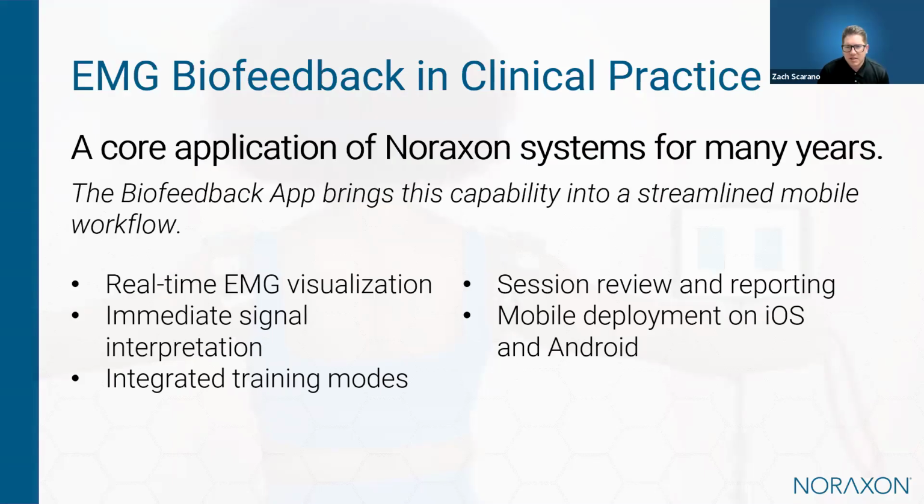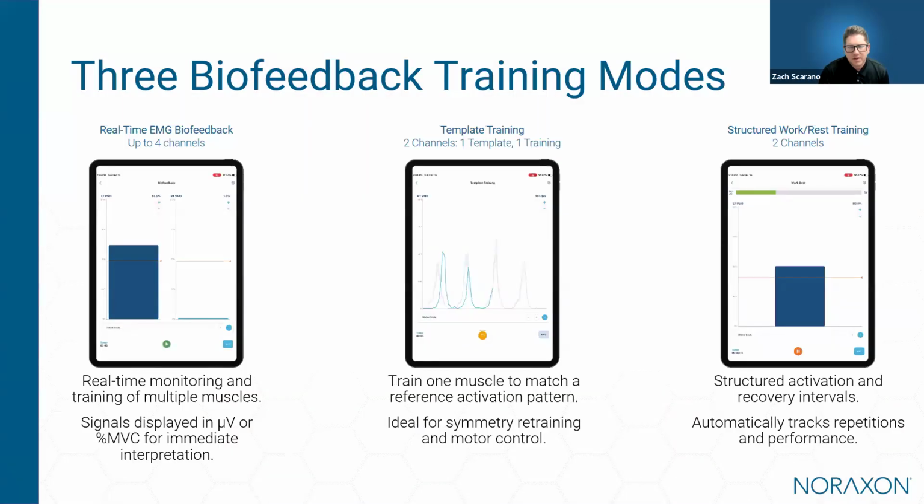And so clinicians can move from sensor setup to training to session review and reporting, all within a streamlined mobile application. And so this allows for EMG biofeedback to just fit much more naturally into everyday clinical workflows. And so with that context, let's take a look at how the biofeedback app actually works.